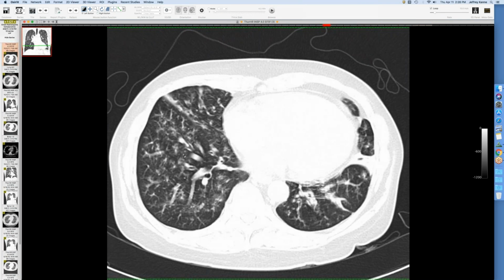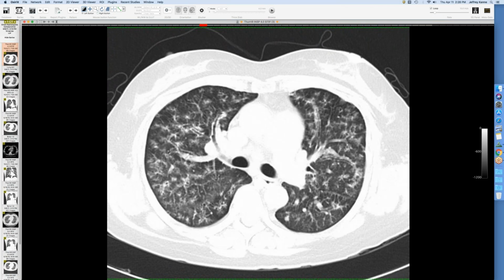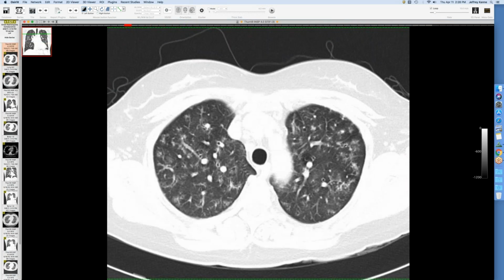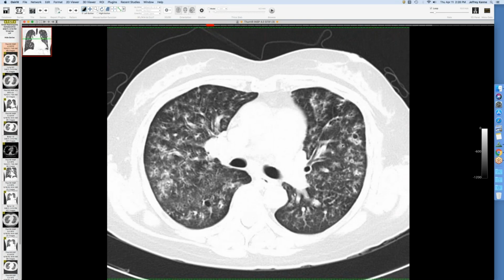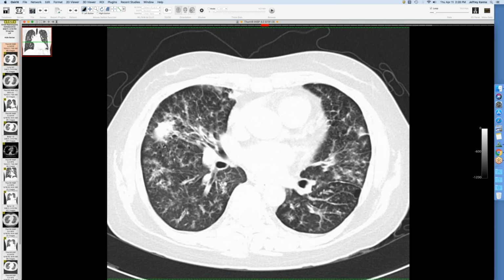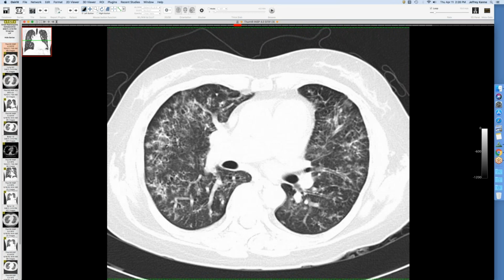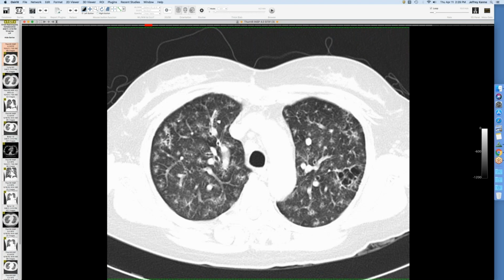So anytime I see stuff around airways, one of the things to consider is a lymphoproliferative disorder, like lymphomatoid granulomatosis. I've seen that give this kind of irregular nodules, but this patient did get a biopsy, and this is all lymphoid interstitial pneumonia. These are probably lymphoid aggregates, and it has been described to look like this. LIP is not just cysts and nodules; I have cases of consolidation, ground glass and septal lines, and then this one is sort of angiocentric, bronchocentric nodules in appearance.